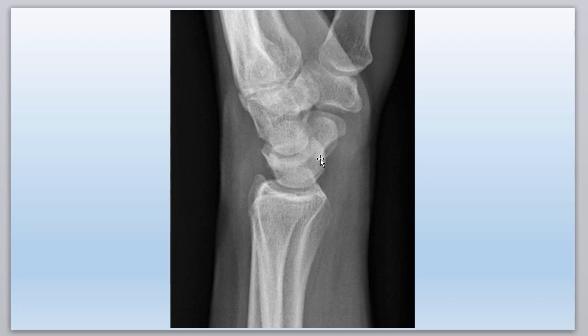Now look closely. You can see another bone right here. That's the pisiform coming around. You can see its shadow here. That's the pisiform. So how do we know if we have a perfect lateral? Because the pisiform will not stick out over here. You shouldn't be able to see it. It should be just inside the scaphoid, just exactly like this. So this is actually a beautiful lateral image. Here's all the other carpal bones superimposed upon one another.